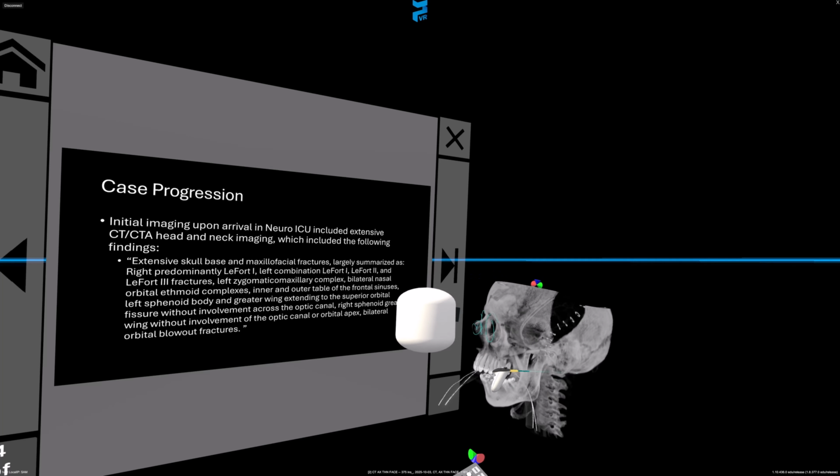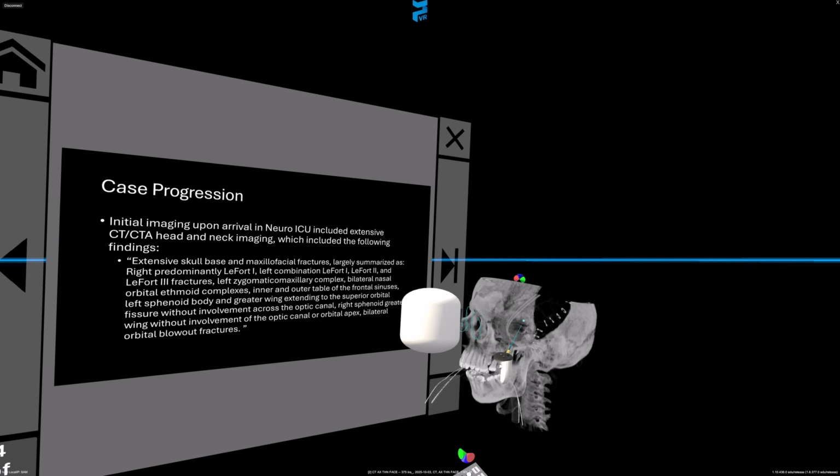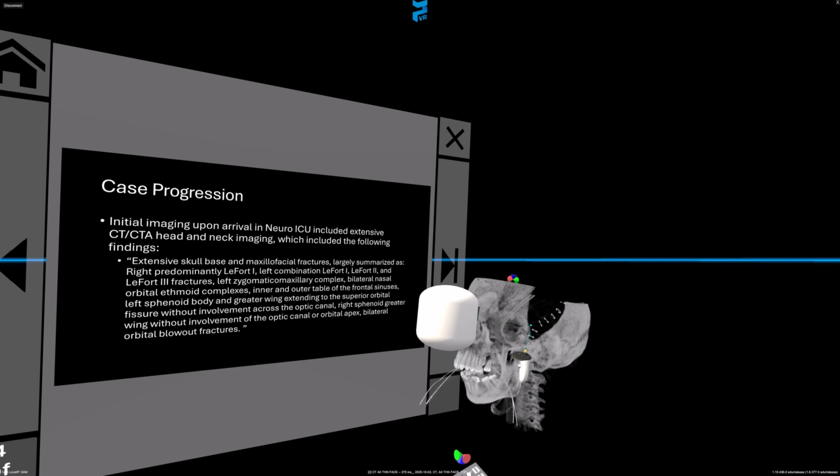Moving over to the left side, we see the zygomatic arch fracture leading from the temporal bone and then into the zygomatic bone, where you have fractures there and there. Additionally, we also have some abnormalities along the superior or the frontal bone as well.